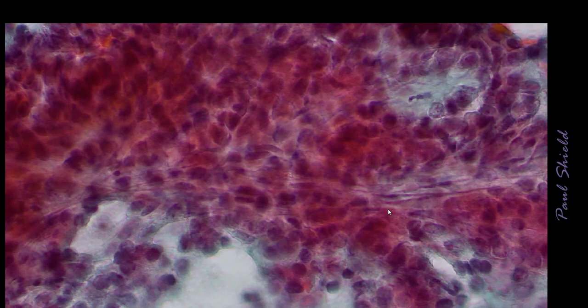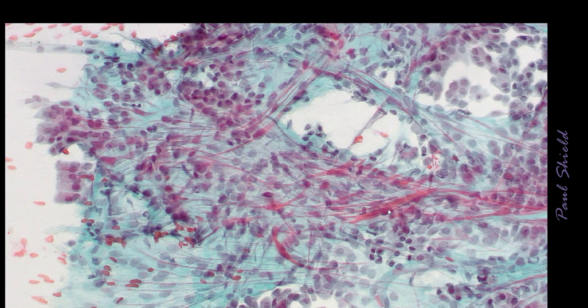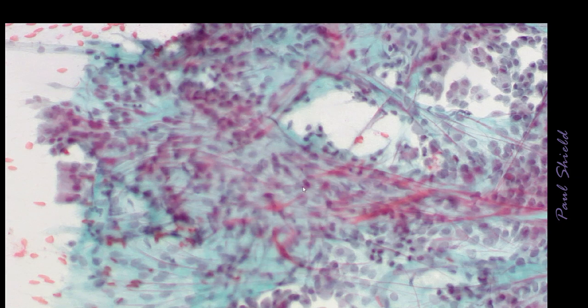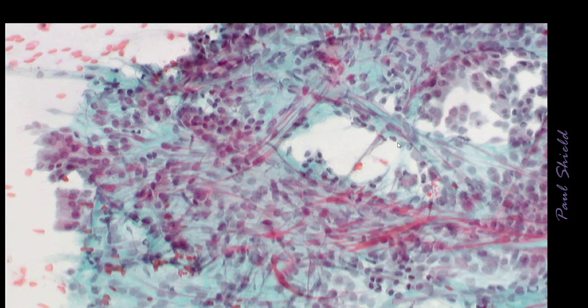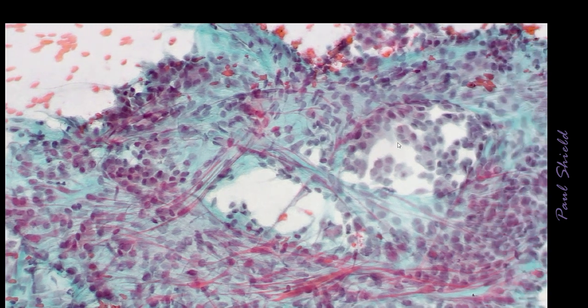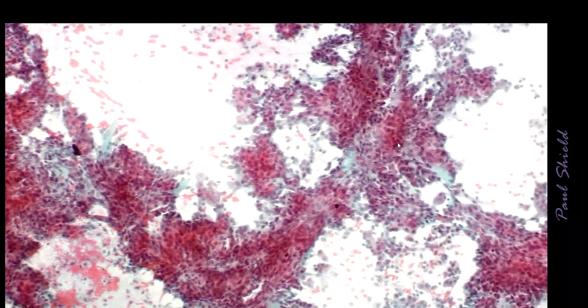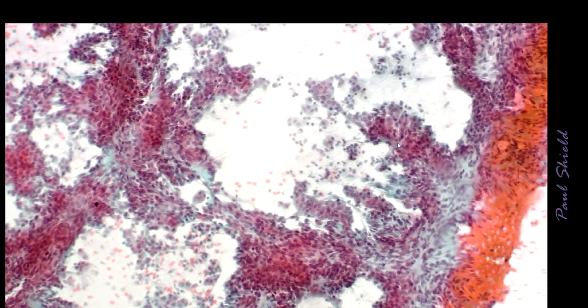And you can see it's quite complicated here. Again, vessels running all through that material. The epithelial cells looking a bit columnar down there. And a lot of them have just stripped off these cores of tissue, but you can see the anastomosing vessels running around there. Just low power again, you can see the cellularity branching of these large groups. So these have just been sheared off by the needle.